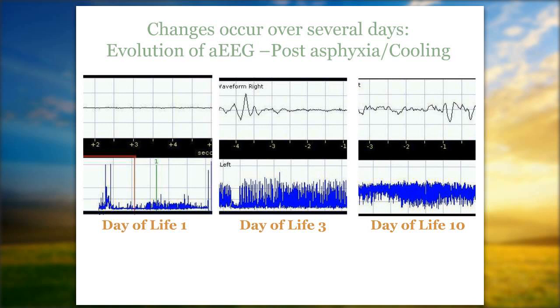So for cooling babies, we're particularly interested in those first 72 hours, and we really want to see, as quickly as possible, a return to that normal voltage, as well as a return of sleep-wake cycling. Studies have shown that babies who do show that return within 48 hours have the highest likelihood of a long-term positive outcome. So we're very, very interested in looking at these aEEG patterns over those first few days of life.